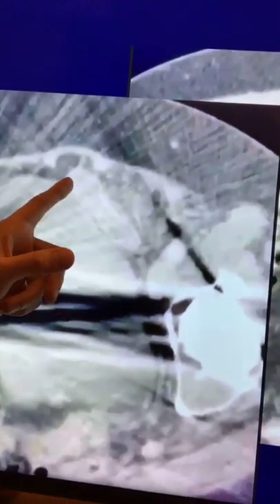Here is the last image that I want to show you. This was on the CT. Anybody went back to the CT to scroll down? This is this juicy appendix right here. Somebody asked me, what is the size cutoff of the appendix on CT to start thinking about acute appendicitis? 6 millimeters. So you're looking at the appendix, you measured it to be 6 millimeters, 7 millimeters, 8 millimeters.